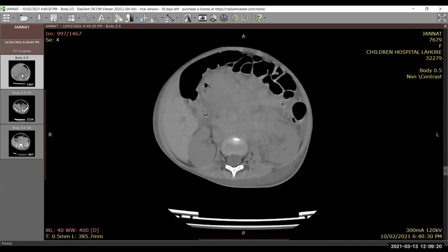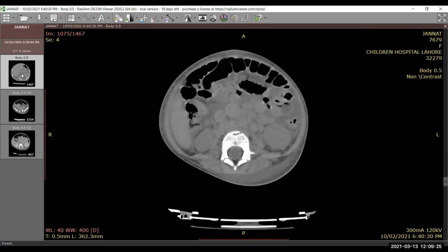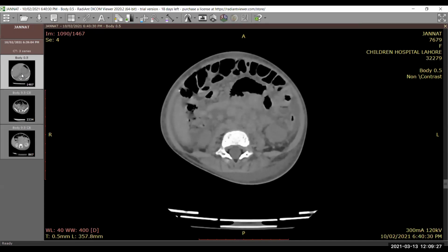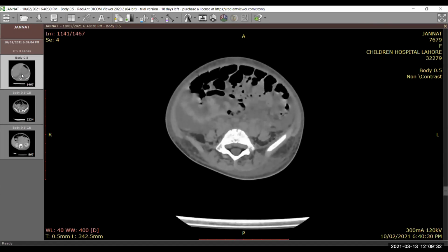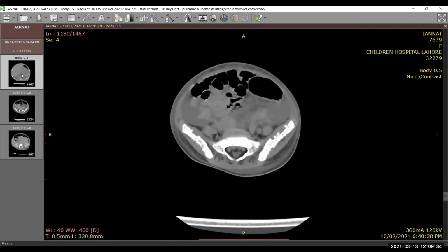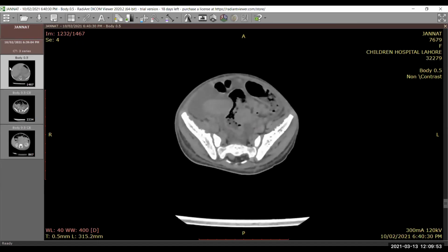This is causing gross displacement of the adjacent bowel loops as well. So in a pediatric patient with a soft tissue mass in the region of adrenals crossing the midline, foci of calcification, ascites, and periosteal reaction generalized throughout with multiple lucent areas, I would be thinking of neuroblastoma as my prime possibility. And in my routine practice, I would proceed to contrast enhanced imaging for further evaluation.